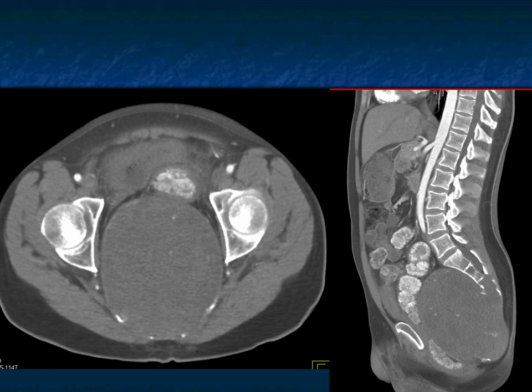Now, you can have large rectal cancers growing posteriorly and invading bone, but there you see dystrophic calcification often, and here the colon is displaced. This is not arising from the colon. You could see metastasis to bone. That's a possibility. You can see tumors of the cord coming in and growing and destroying bone. I guess that's a possibility.